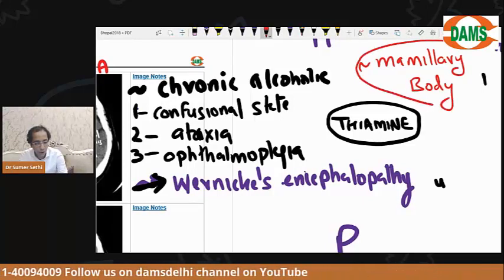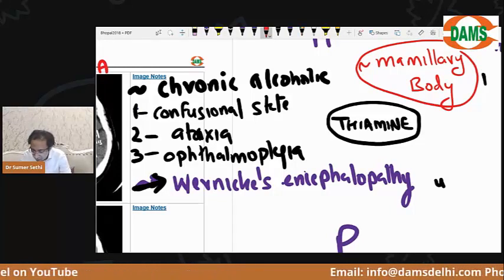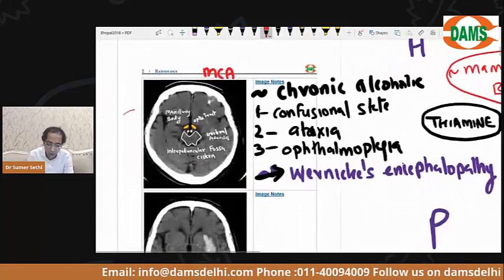Okay. There can be more areas of involvement, but mammillary body involvement is typically seen in Wernicke's encephalopathy. Very good. And I can see that most of you are able to answer this.